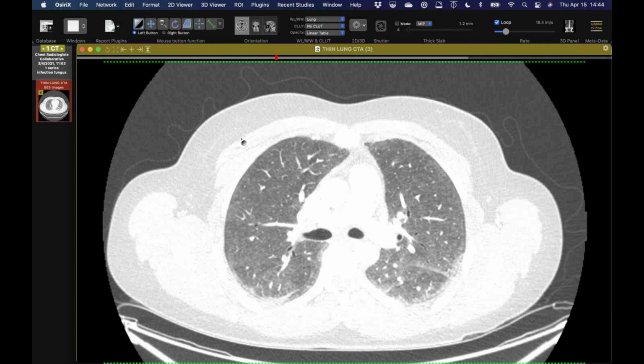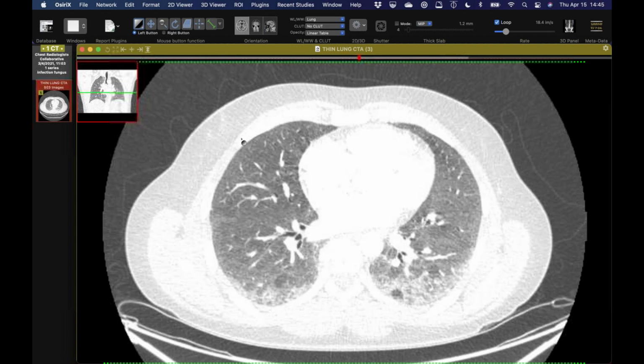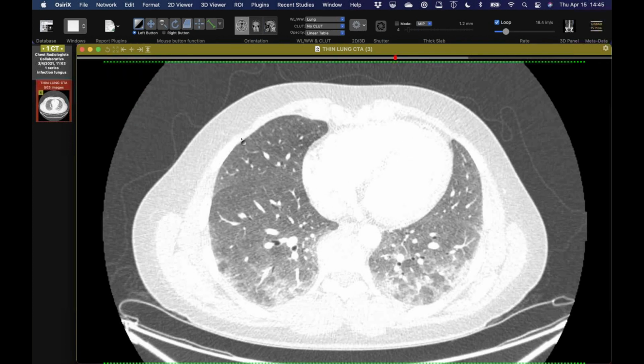This is just a follow-up on a case I showed some of you. I can't remember if I showed it on the webinar, but I was asked to review this case. It was a young woman who had been in California and then in northern Wisconsin. And this was billed as cocci. So I sent it to all of you on the West Coast and said, I don't think this is cocci. What do you think? It looked more like HP than anything. But what confounded it was her dog; they were excavating a swimming pool in California, a risk factor for cocci. The dog had cocci, and she had a positive cocci IgG.